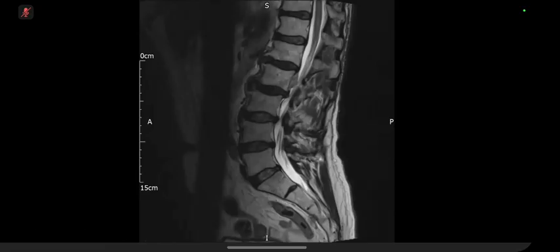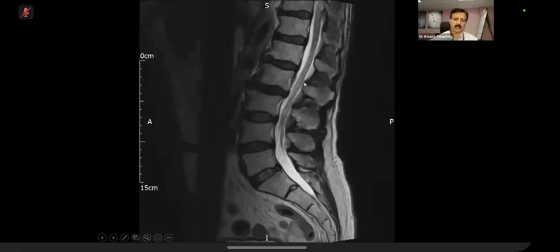There's a protrusion at the disc, bulging of the posterior disc, although it seems separate. Where? Point out. Your mouse is not showing. Yeah, where your mouse is, just near there. Okay, so let's go to the other sequence quickly, to axial.